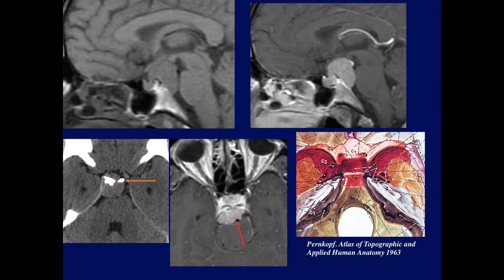So here we have a small lesion at the upper end of the clivus. Here's the clivus on the anatomic diagram, partly sphenoid, partly occipital bone, and we can see a clival meningioma displacing the basilar artery posteriorly. What are these two calcifications? Which one of them is more involved with the tumor? What anatomic structure is that?